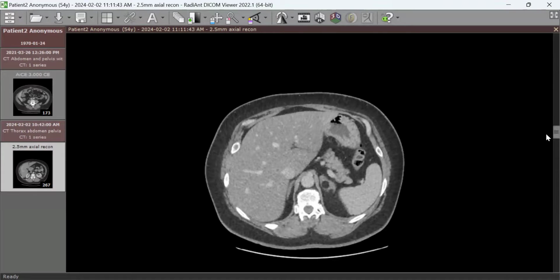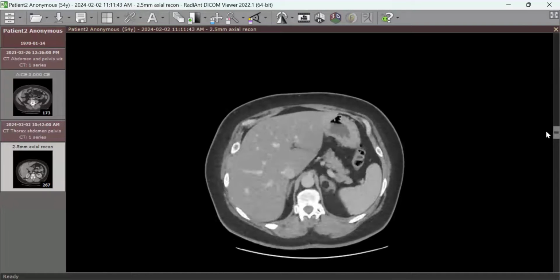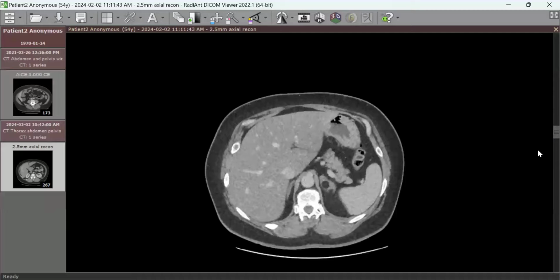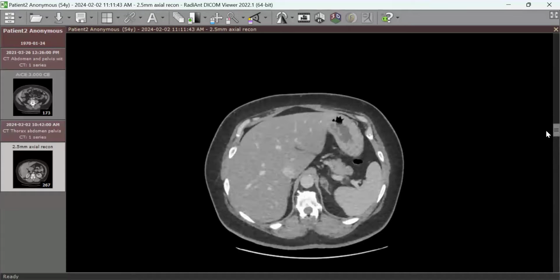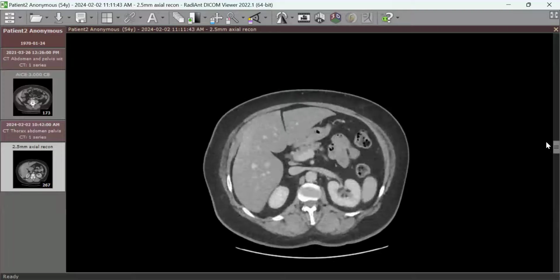So do you think this lesion is causing trouble to the patient? No. What's this lesion? This lesion is mostly myelolipoma, usually incidental. It's rounded, fat density, no problem. And the left adrenal is diffusely thickened. So we identified myelolipoma, hepatic steatosis, umbilical hernia.